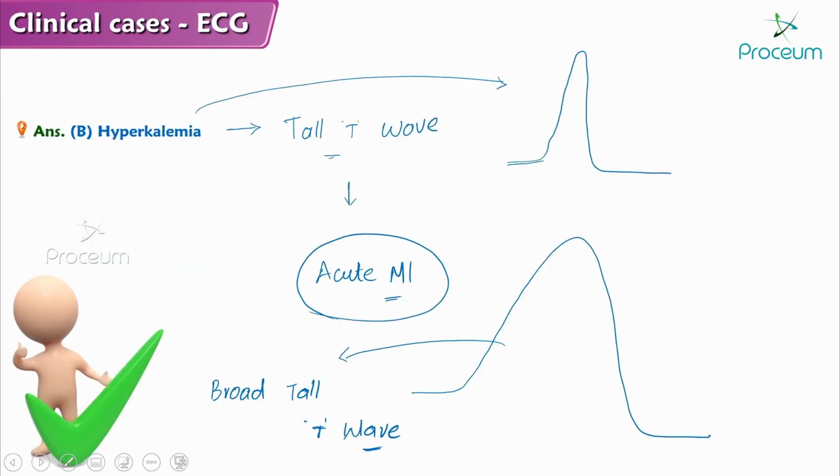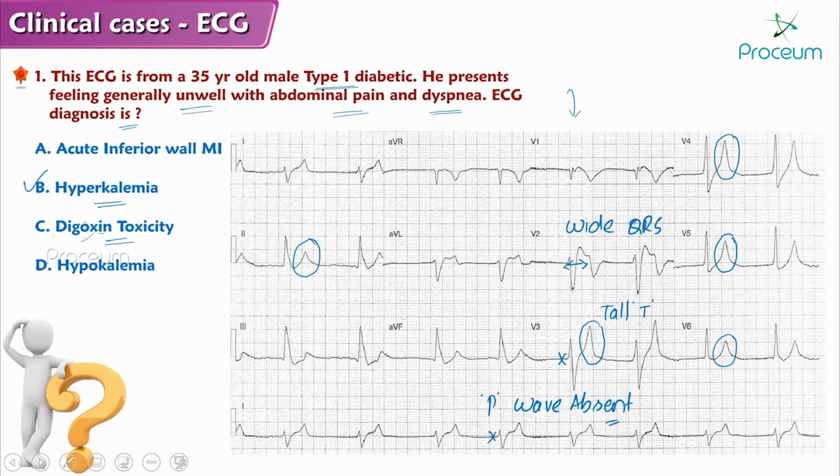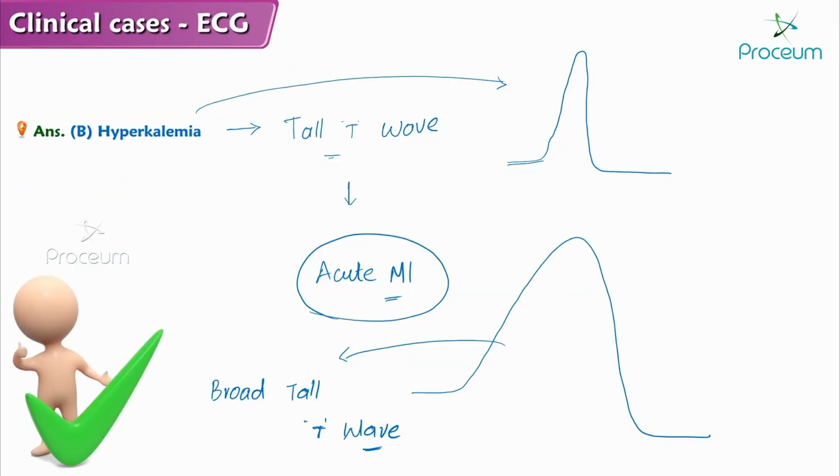So this was the clinical question related to your hyperkalemia, and I have also tried to explain about the other options as well. Now we will move on to the next important clinical scenario.